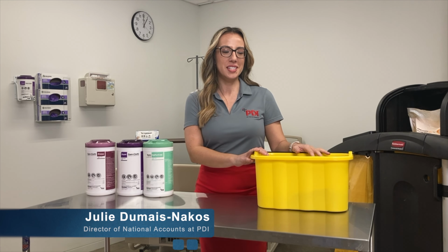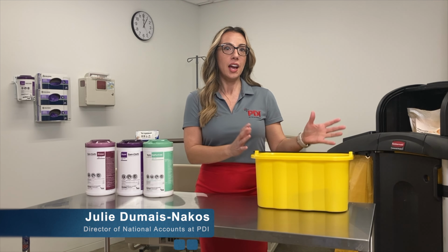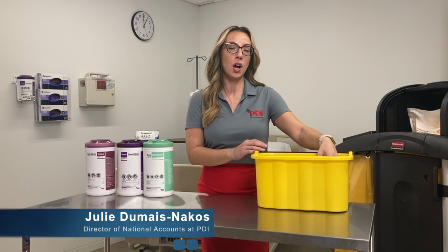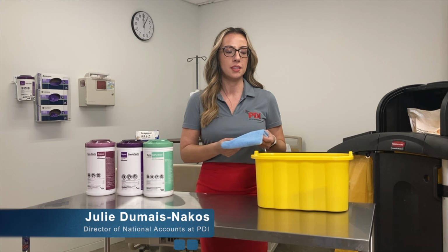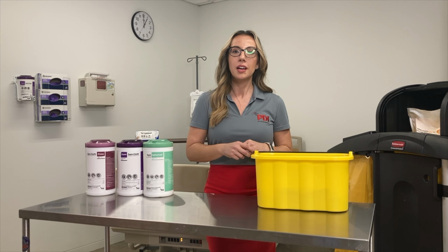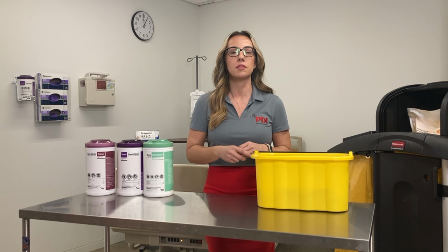It's this. We see a bucket that is used alongside a liquid disinfectant. And we see everything from a disposable cloth to a simple washcloth, and most commonly, microfiber cloths. Let me explain a little bit further. Chemicals are dispensed through a chemical dispenser where they mix with water, and they're supposed to come out at the correct parts per million to ensure proper surface disinfection.